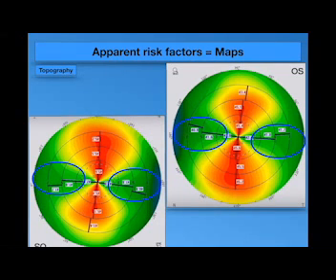Normally the inferior cornea is somewhat steeper than the superior cornea because of the pressure of the upper eyelid, which is more than the lower eyelid, because the lower eyelid doesn't press on the inferior cornea. So there is some flattening in the superior part of the cornea in relation to the inferior part.